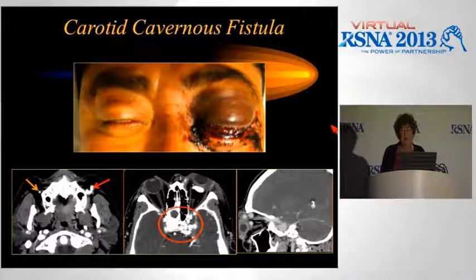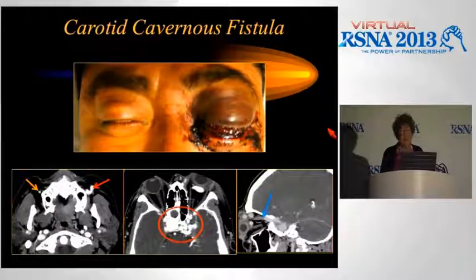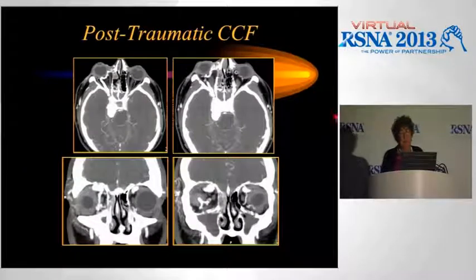And then, of course, we have our perfect clue here in the parasagittal images when we see an enlarged arterialized superior ophthalmic vein coming from the cavernous sinus. And here you see multiple other venous structures in the orbit, way too large. They just don't belong there. So you must be able to recognize this. This person needs immediate angiography and perhaps embolization or coils.